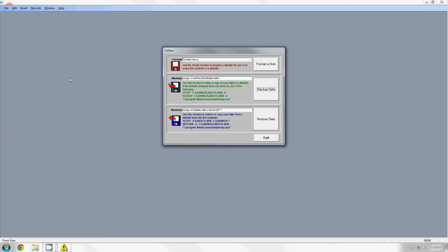You're done. Do not double click the file. If you go into your portable device to see if the file's there, do not double click it to make sure that it backs up everything. Sometimes if you do this, it will be opened up by another program, not by Lab Manager, which can cause corruption of the file, which means you have to start all over again. It will back up assuming everything is set up correctly and file names have not been altered. It will back up your accounts, products, materials, history, payments, everything that you have typed into Lab Manager.